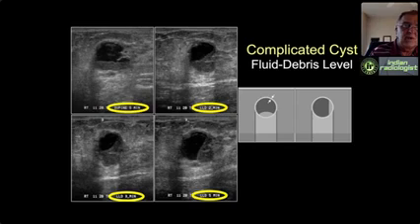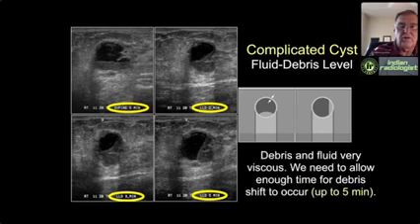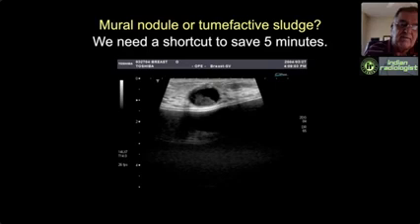That's somewhat of a problem, and there's a shortcut we can use. So here's a case of an inflamed cyst with tumefactive pus.